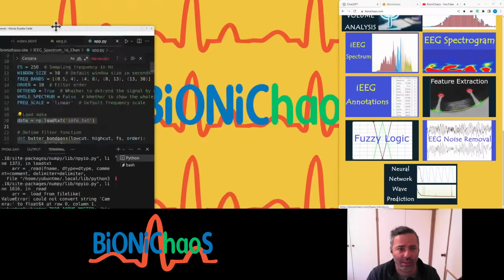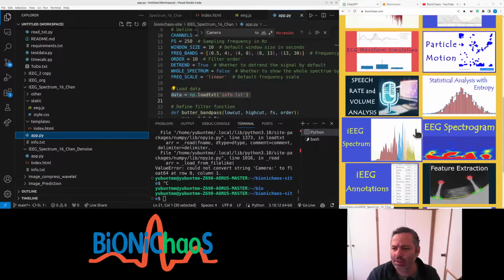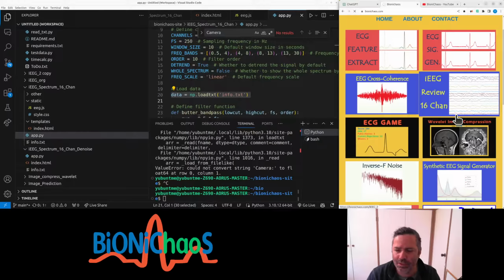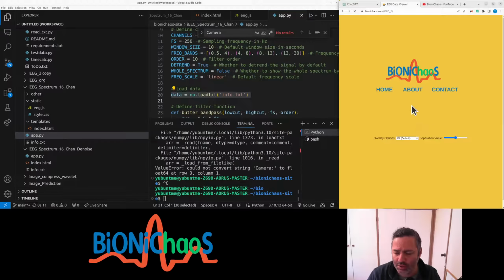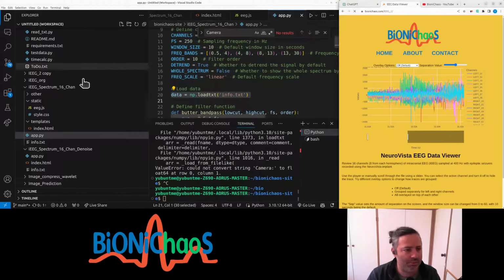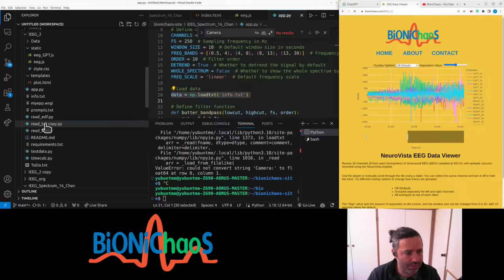Loading the data. Okay, we obviously have it in this application. It's not great, it's super slow, it's still loading, and there's all sorts of issues with display, but it's able to load the data.